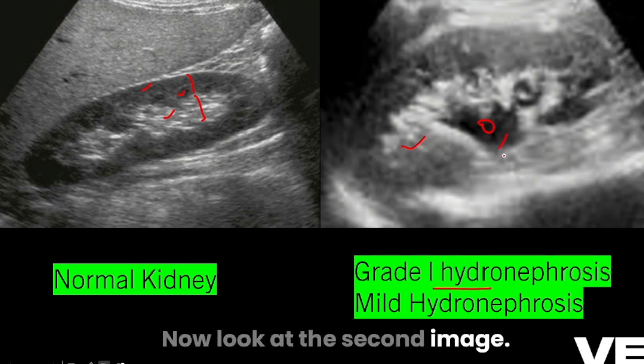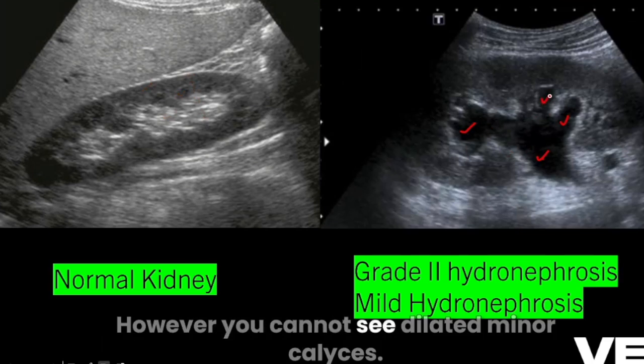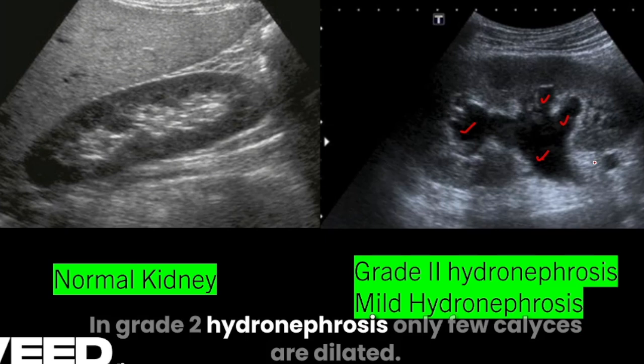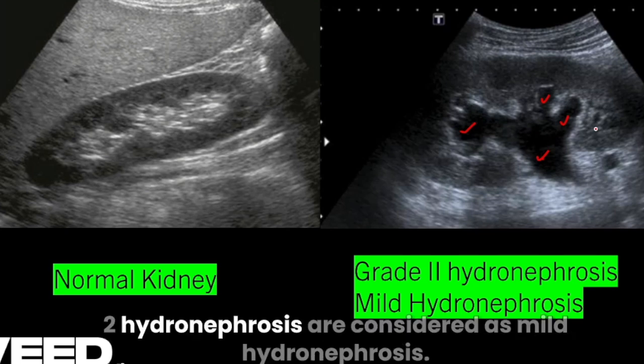Now look at the second image. You can see along with the renal pelvis, the major calyces are also dilated. However, you cannot see dilated minor calyces. In grade 2 hydronephrosis, only a few calyces are dilated along with the renal pelvis. Grade 1 and grade 2 hydronephrosis are considered as mild hydronephrosis.